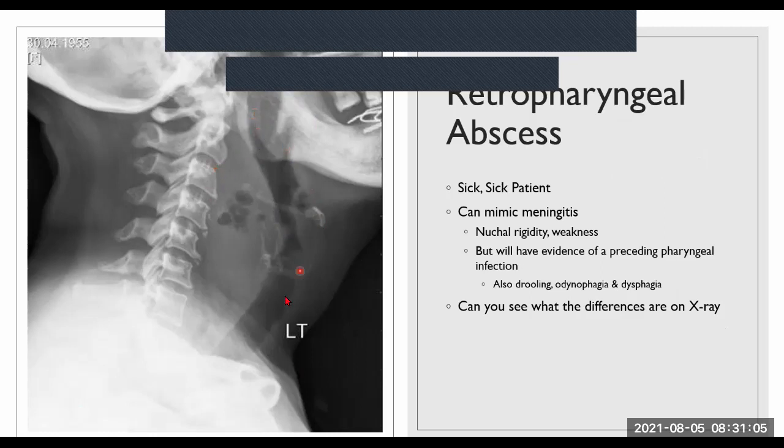Where's everything? Yes, very good. So it's been moved very far away. Even if you don't know the exact distances, which we'll get to in a second, the most important thing is that everything's been pushed away from the spinal cord.